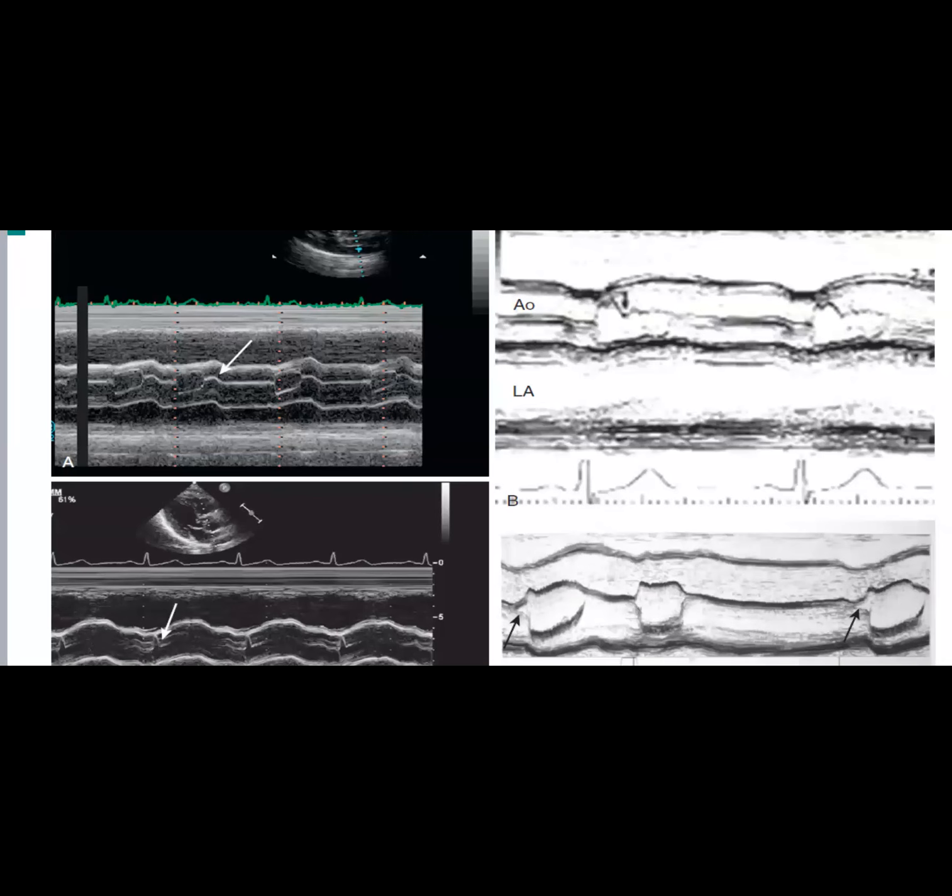What do you see here? It is mid-systolic closure. Exactly. Mid-systolic closure indicating HOCM. Good.